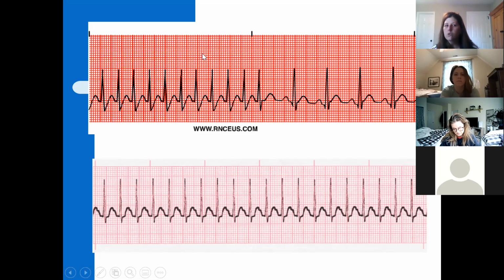The number of little squares inside each big box still measures the same. It's still going to be the same. It's not going to be like, oh, this one's 8 wide and 8 high versus this one's 5 wide and 5 high. Don't let that confuse you. That's not going to change. Okay, but let's count this one out, okay?